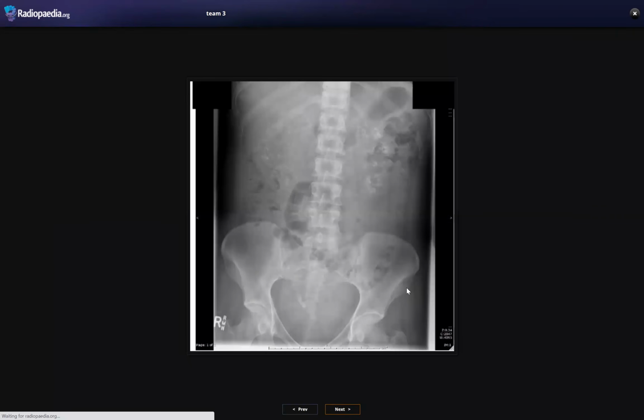Okay, next case. So this is the X-ray abdomen frontal projection, and I could appreciate there is bilateral medullary nephrocalcinosis seen in both the kidneys, more on the left side, and no evidence of any calcification in the line of the ureters or urinary bladder. The rest of the visualized bowel gas pattern is unremarkable. So the differentials for the medullary nephrocalcinosis would be medullary sponge kidney, hyperparathyroidism, renal osteodystrophy, renal tubular acidosis, or any causes of hypercalcemia. So the patient needs detailed history and further imaging.